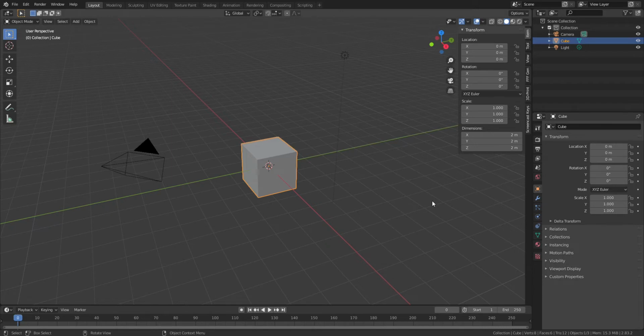After the first two parts, where I showed the process of segmentation of the mandible and fibula, I have imported those two models in Blender previously and cleaned them from some errors, such as gaps and small islands of vertices. Previously I met with the surgeons and they decided to have two segment grafts harvested from the fibula shown in this video.